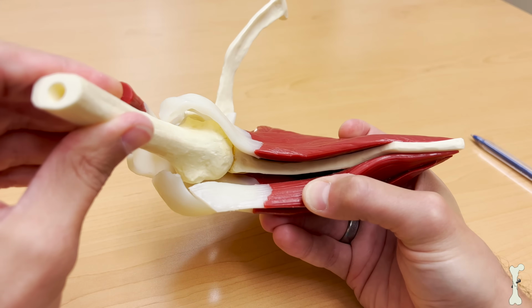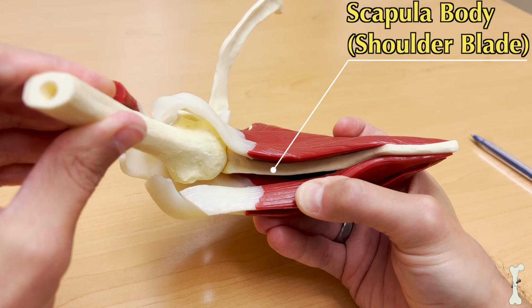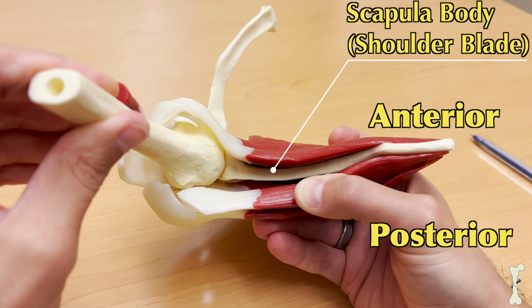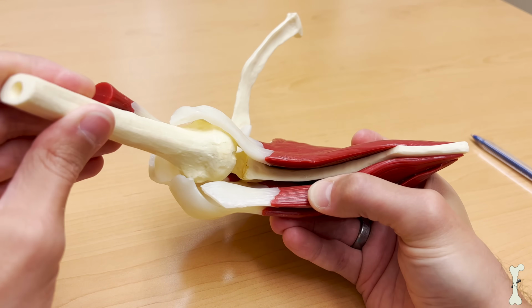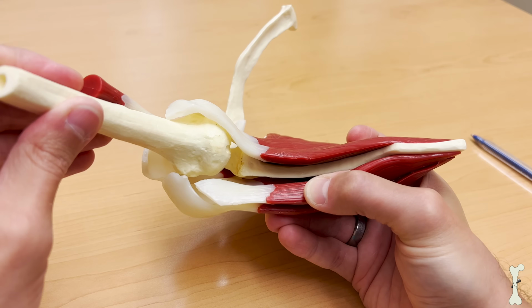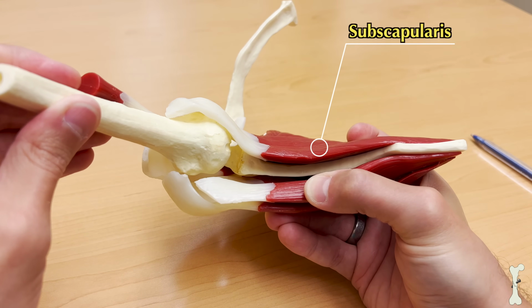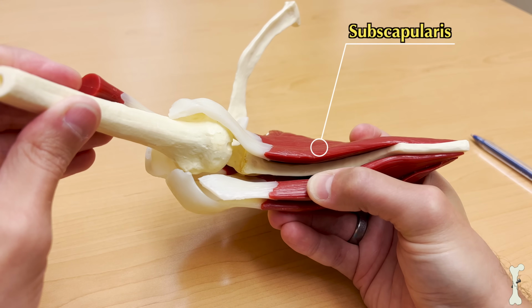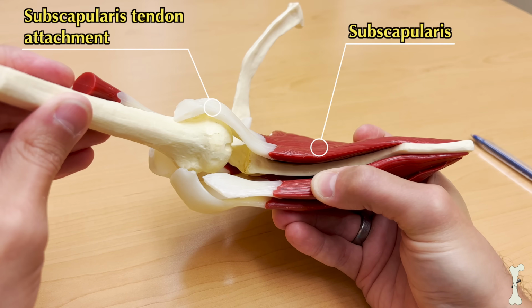The shoulder blade itself is in this location, and the front of the shoulder is here, the anterior part of the shoulder, and the back of the shoulder is here, the posterior aspect of the shoulder. The muscle along the anterior aspect of the shoulder blade is the subscapularis, and we can see where the muscle attaches, and then as it extends laterally towards the outer side of the shoulder, we can see how the subscapularis tendon attaches to the humeral head.